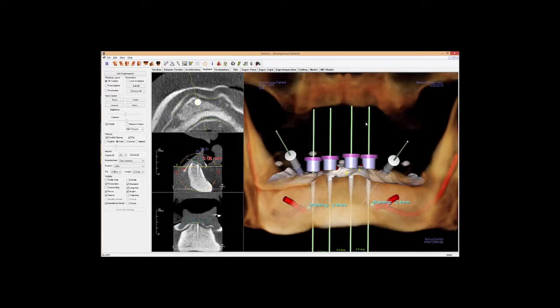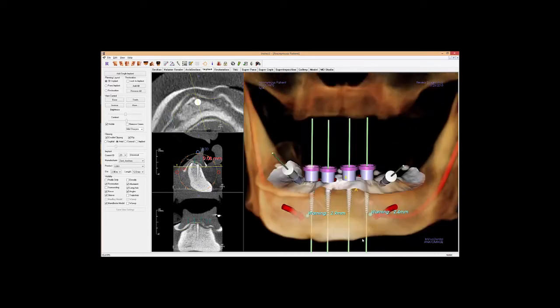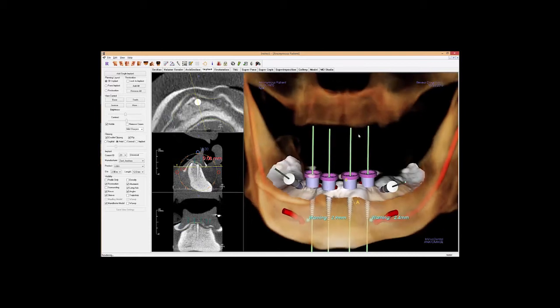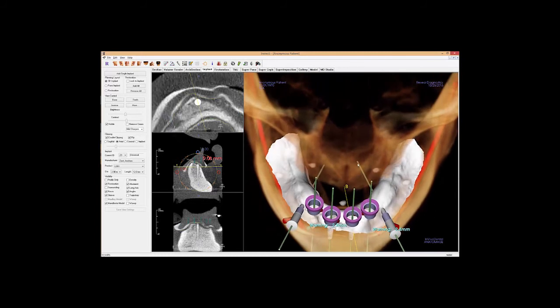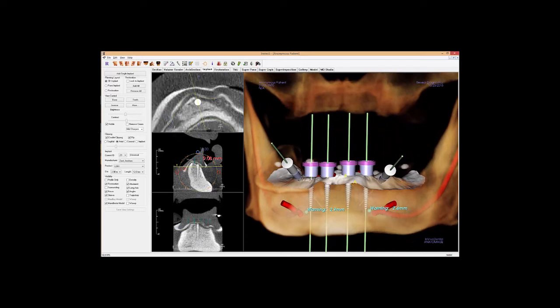With that, when you get everything back, Anatomage will send you a surgical guide. They will send you a printed model. So they will actually print this and ship it out to you, which is nice. And the last thing you'll get is a reference chart, and that chart will tell you a list of the implants that we've chosen and what diameter and what length that we're using for each site. So really nice tool. It makes the whole process a lot simpler.